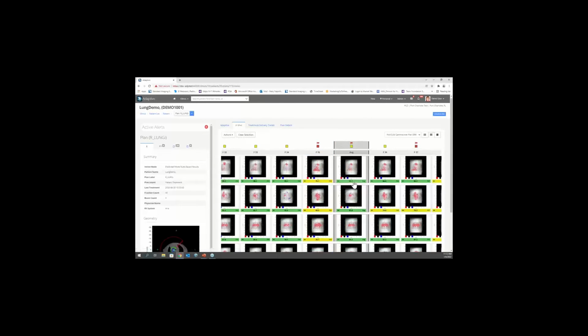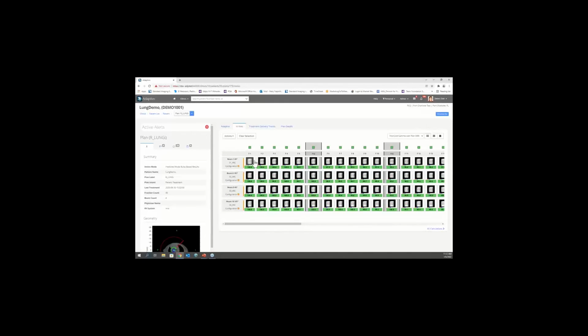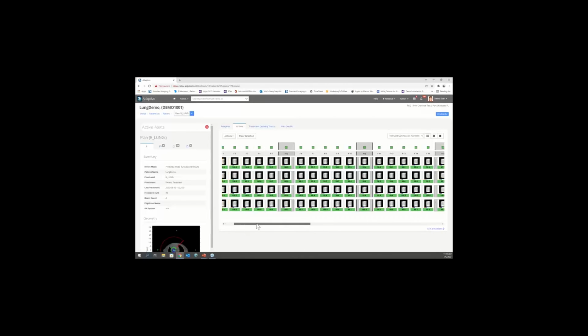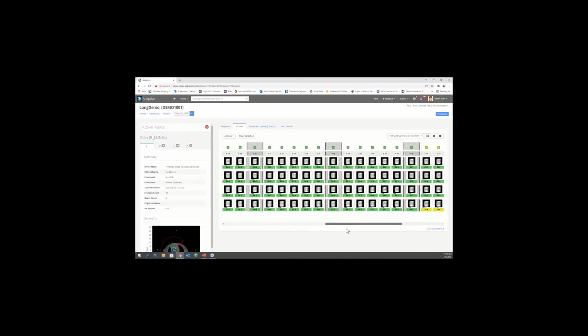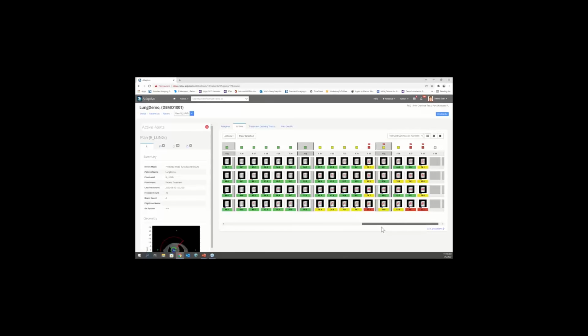I can clear the selection so that we can see the gamma analysis for all of the beams and fractions. As you can see, these hotter areas have increasingly been present from the beginning of treatment. Over here, at fraction 1, we have 100% gamma pass rates, and then as you scroll through, you start to see larger regions of gamma failures.